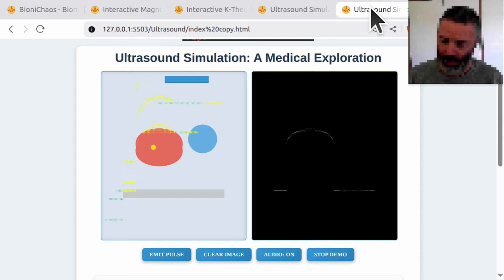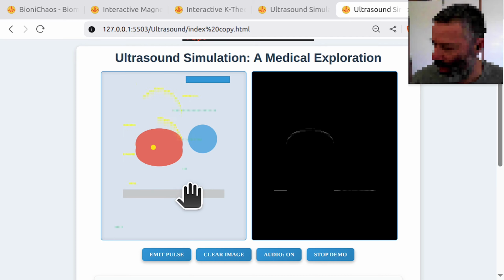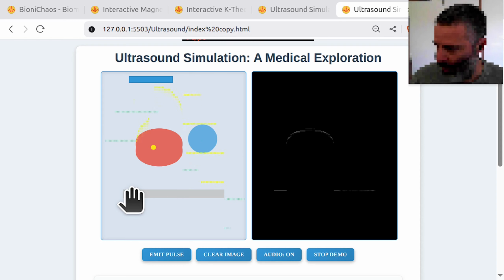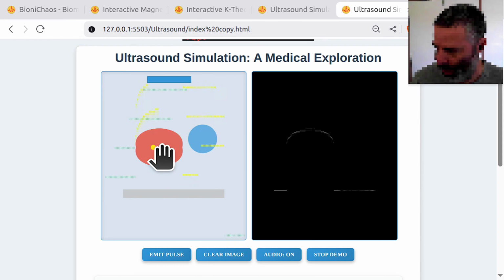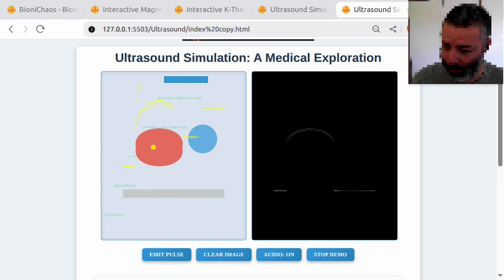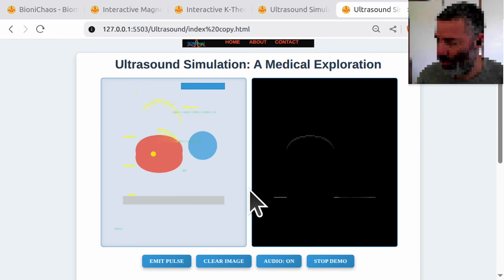So in theory we should be able to change the parameters and then it will be tuned for one or the other, and the bone as well. So currently I would imagine it's finding only the bone and the kidney. So can you explain that? We need it in the explanation below the page.